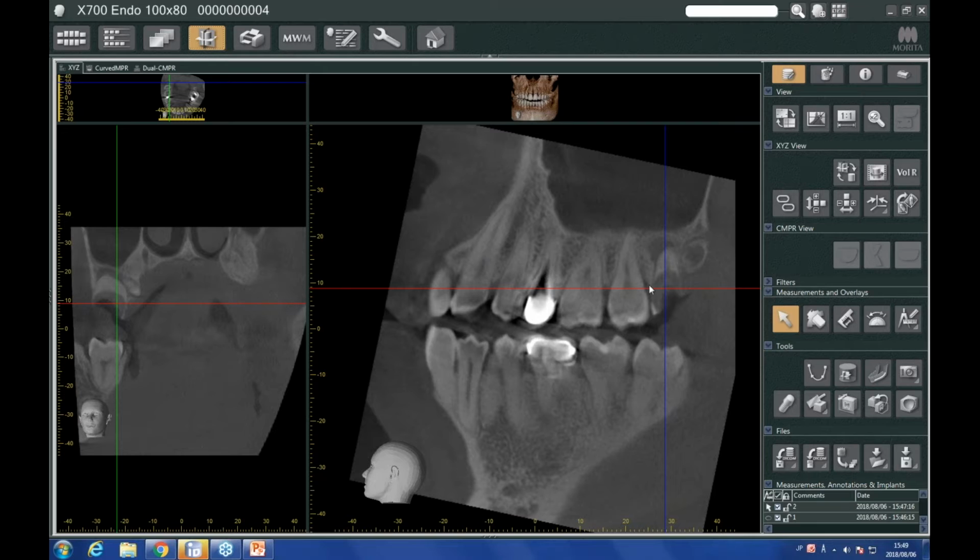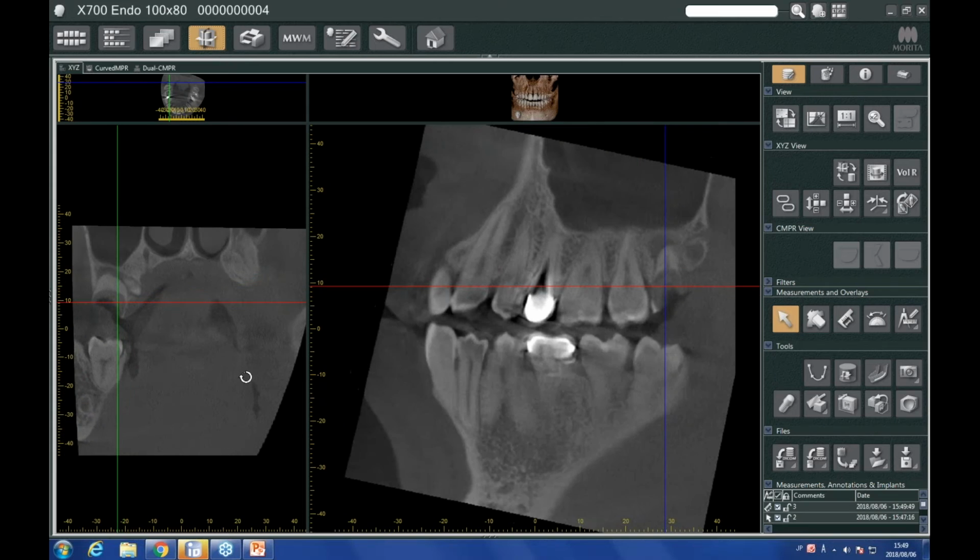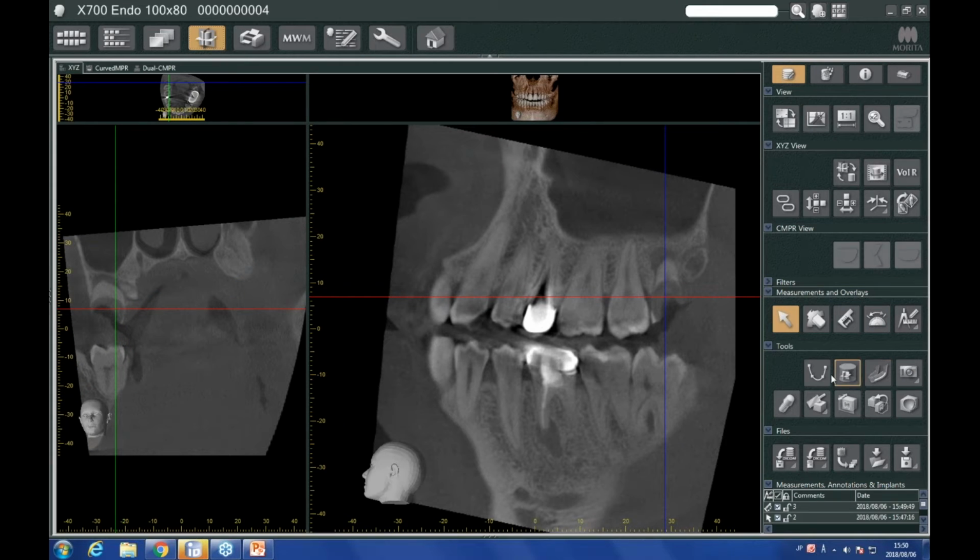And the same thing is going to be true of your cone beam CT. If you slice an image at an angle like this, you can see this tooth here actually elongate, okay? So for example, if I measure this now using this measurement tool, this is end to end about 16.83 millimeters. But if I straighten it up, and I again go end to end, 13.1 millimeters.